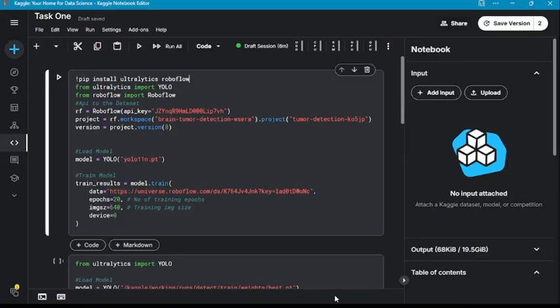I'm Robbie from Nigeria. This is my project on brain tumor segmentation using YOLO11 and the SAM2 model. I ran the whole code on Kaggle using its GPU. The project is to detect brain tumors using YOLO object detection and the SAM2 model, Segment Anything Model, for precise segmentation.